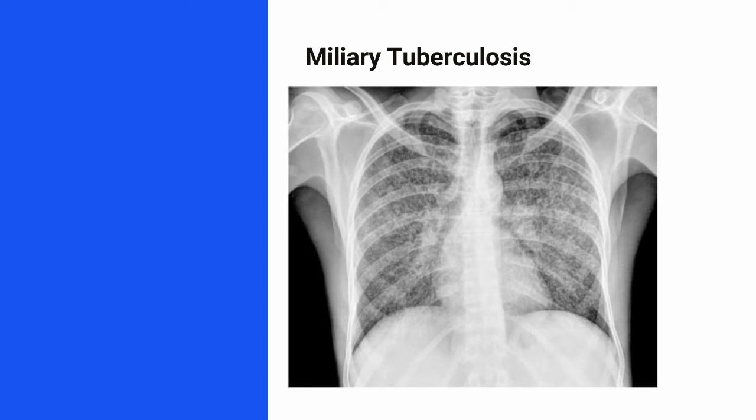This is a chest X-ray of a case of miliary tuberculosis. You can see in both the lung fields scattered nodules caused by the miliary tuberculosis lesions.